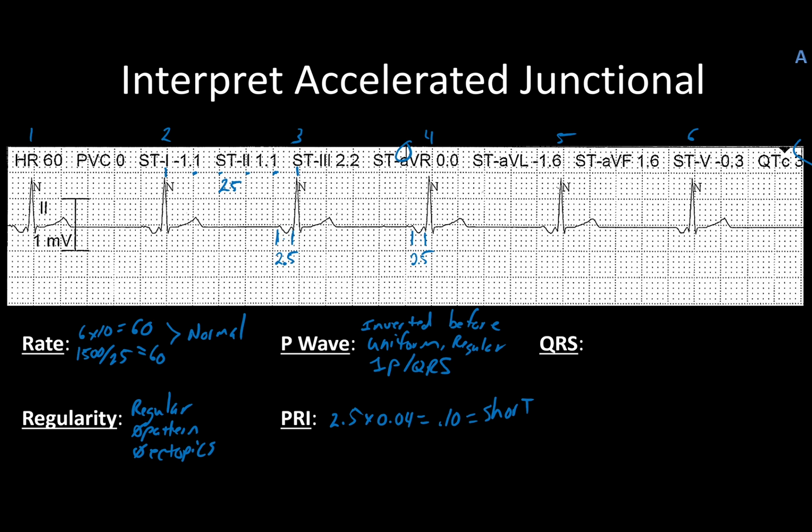Lastly, the QRS, they are uniform. They have QRS pattern. And if we measure these guys out, I'm going to say, let's go with this one here. Starts about halfway through, ends about halfway through. 1, 2.